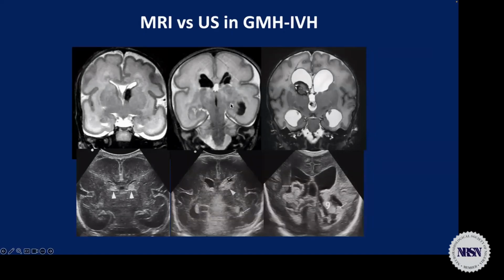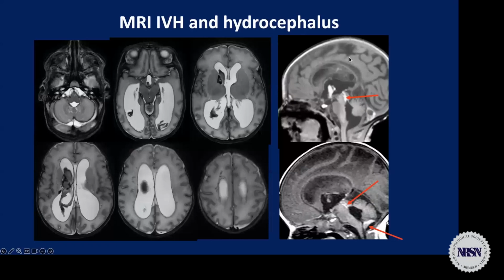You can see here, of course, magnetic resonance may depict very well the presence of hemorrhage, can depict very well the presence of this thrombus, this coagulum here, and the increase in size of the supratentorial ventricle. It can depict very well in these two cases how the clot is present within the aqueduct, leading to an occlusion of the aqueduct and also to the foramen of Magendie, so a dilatation of the fourth ventricle.